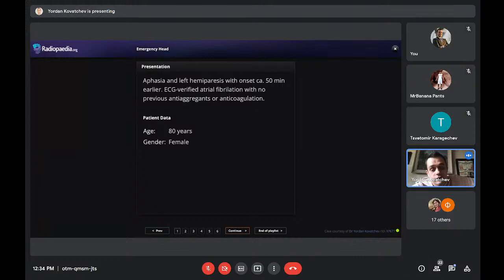It's a rare complication, but mainly I want to show you vasogenic edema, slight vasogenic edema, and as we said, to think about clinical correlation. Okay, I won't take any more of your time with everything hypodense in the brain. Hypodense, remember, darker. Now we'll move on to hyperdense.